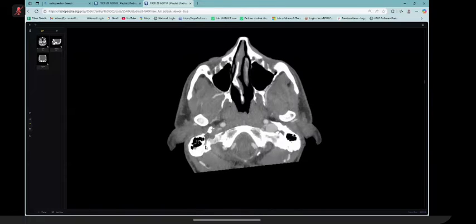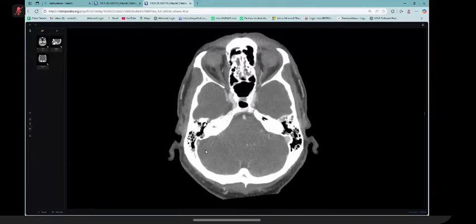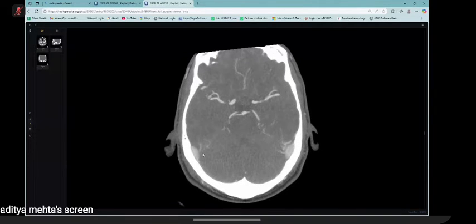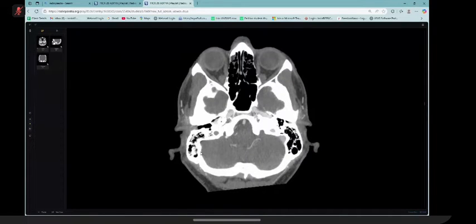And then you can say that this is a safety finding, an immediate concern. I will raise the issue to the referring clinician and request urgent stroke team referral or review, or urgent vascular team review, something like that. But yes, it was a bit tough case. You need to develop how to assess these easy cases with rare areas. That would be my next teaching point from this case.